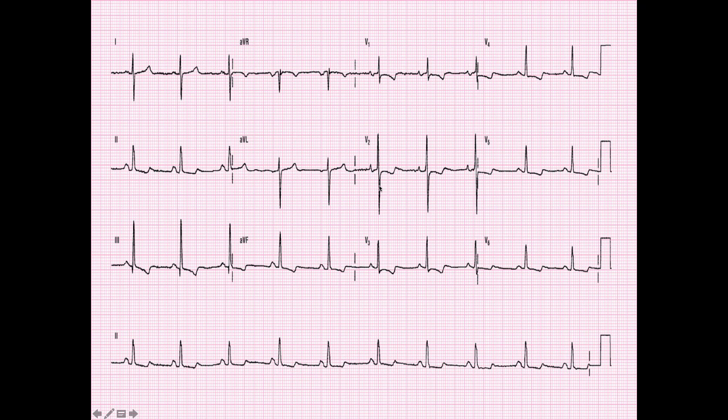Definitely V2. We've got 5, 10, 12, and maybe like 15. We'll say 15. And tallest V6, V5. Looks like V5 might be the tallest there. 5, 6, 7, 8. So 8 plus 15, 23. Don't have that criteria. Do I have any complex that's at least 45 millimeters in and of itself? Negative or positive, so negativity or positivity. Nope, it doesn't jump off the page.